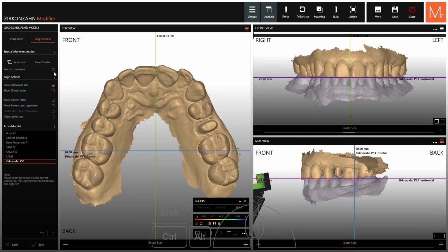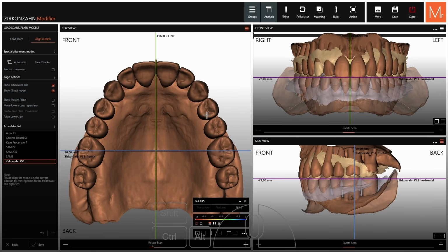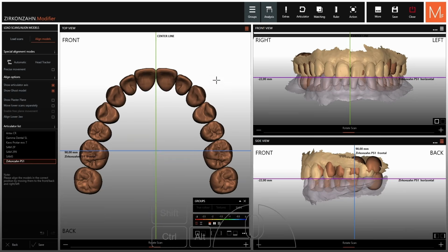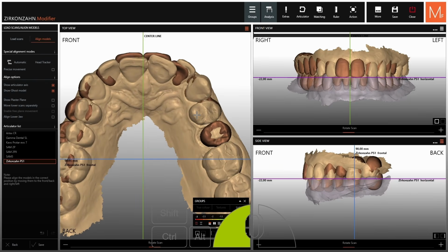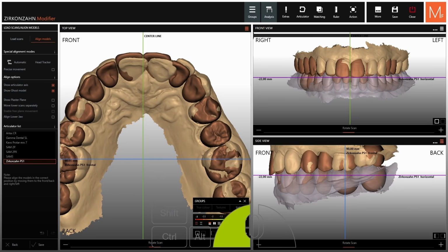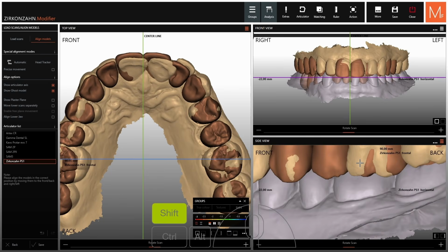We also have an additional help, which are the ghost models. They are pre-aligned sets of teeth and show us the positioning of the library teeth in the articulator. We can toggle through the different sizes by right-clicking on the ghost model. Either we choose the ghost models for edentulous cases or the tooth arches for crown and bridge restoration as help for our alignment. With that, we can immediately tell where our library tooth will fall in place. While the library teeth are visible, we can reposition our models a tiny bit to avoid deep intrusions.